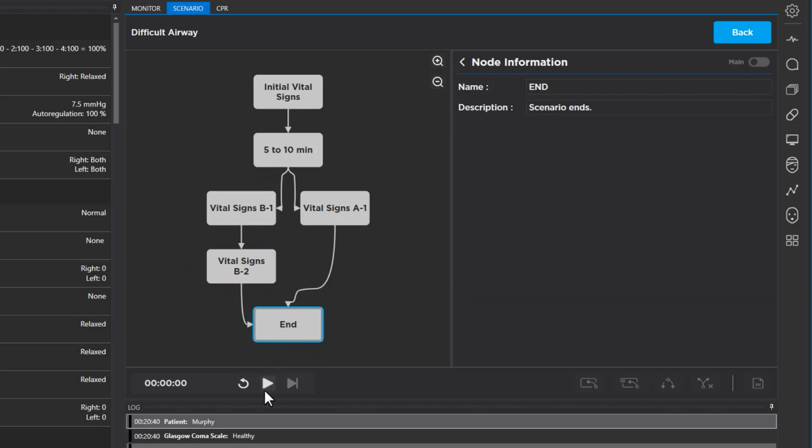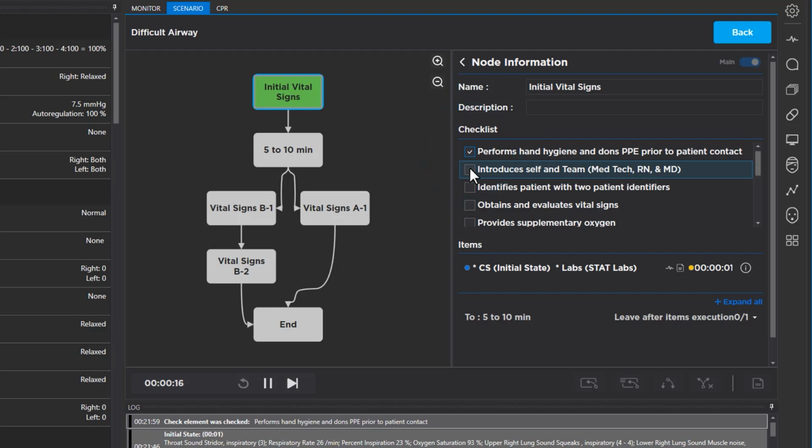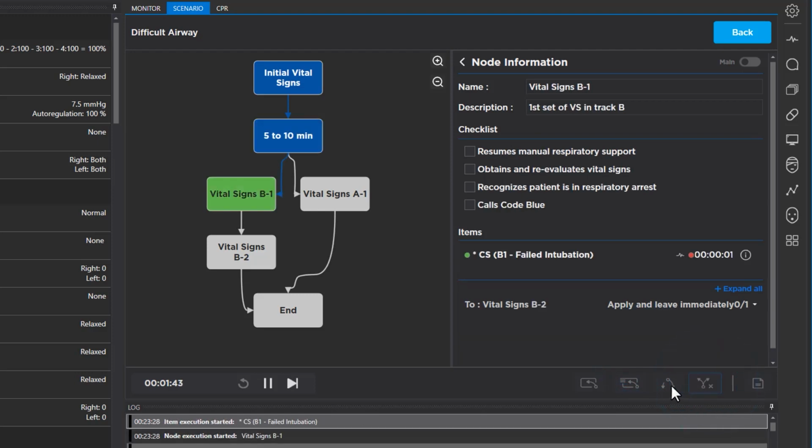During a scenario, vital signs will change automatically to simulate the patient's condition and respond to select actions by the provider. Follow along on the right side of the window with the facilitator's guide to mark off key events or direct the scenario as per the facilitator's guide. You can override settings at any time or pause the scenario to run on the fly.